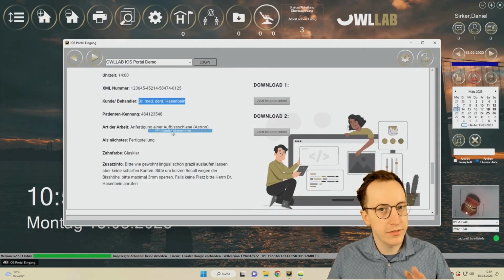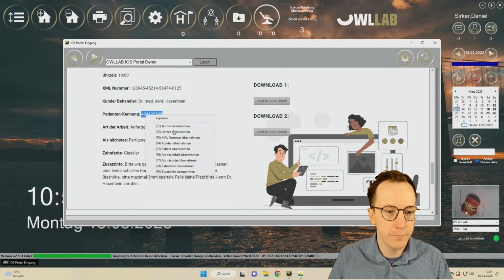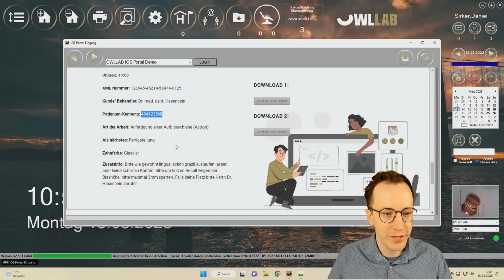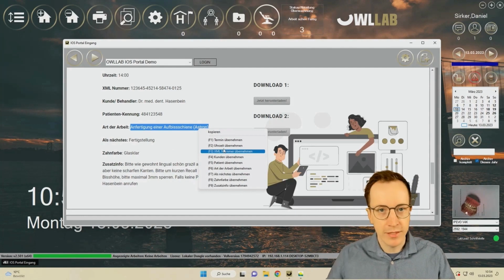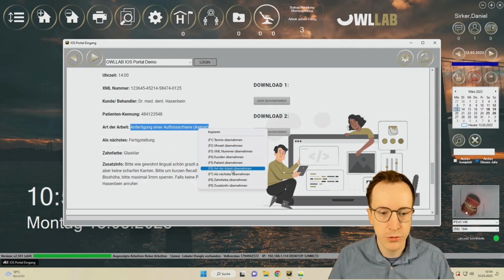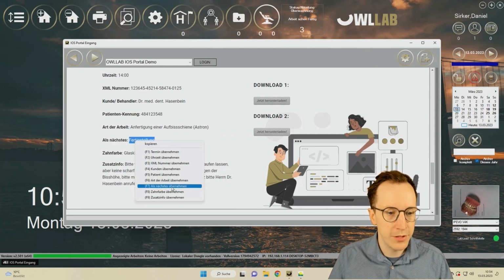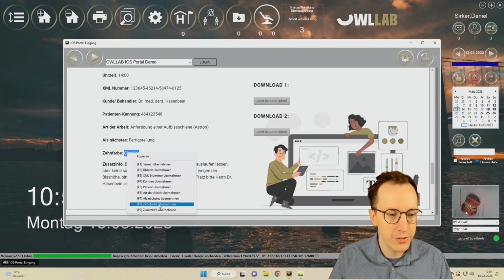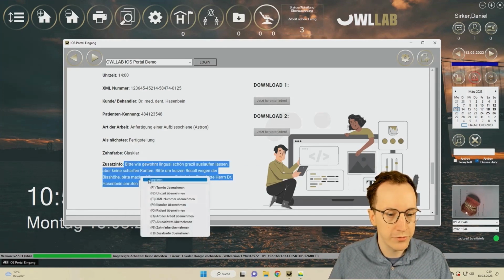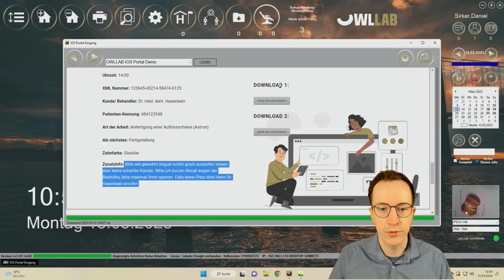I mean, as I said, this is now a demo website. It is perfectly prepared, all the information. All are perfectly aligned. In other portals, it frequently happens that it is in 2 or 3 different masks, but then you simply put it together accordingly, ensuring proper alignment. So the next appointment will be a completion. The tooth color, yes, well, that's clear. We'll still take it with us. And I also want to take all the additional info as additional info, and of course also the file downloads.